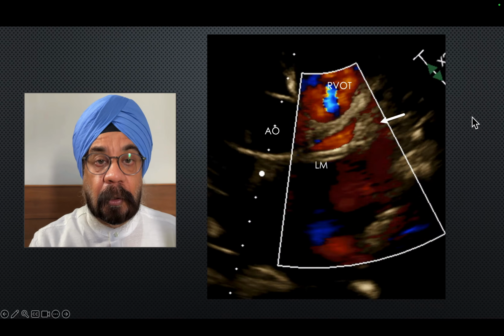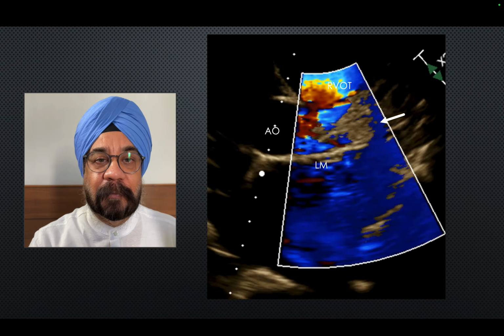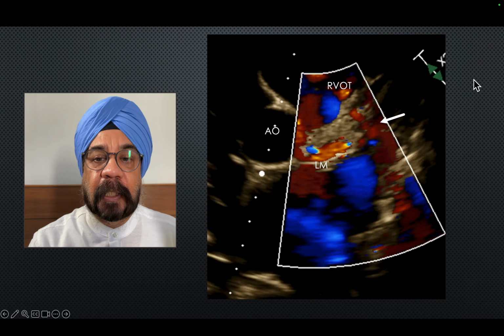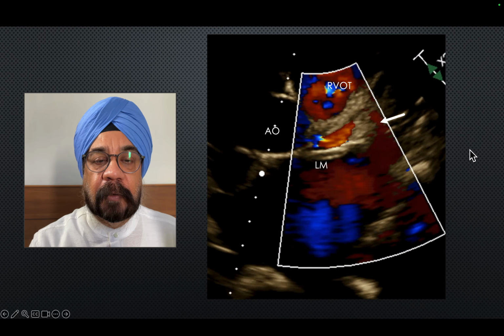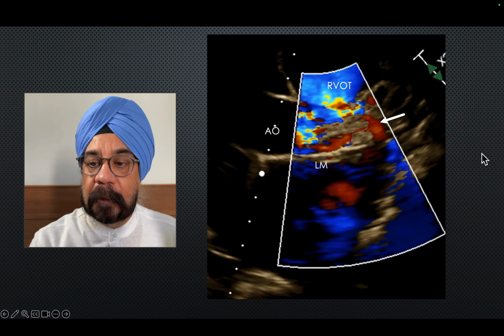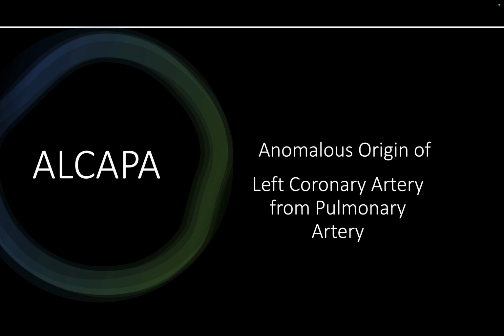So you can get a lot of information provided you keep your level and scale up when you are looking at an echocardiogram. You want to see as much as you can. This is a pure, simple bonus, a kind of gift, a free thing that you get. Otherwise you could have finished performing echocardiography in the routine manner. Let me show you a case of ALCAPA which I showed in one of my YouTube videos.